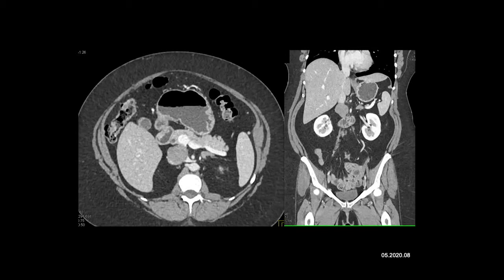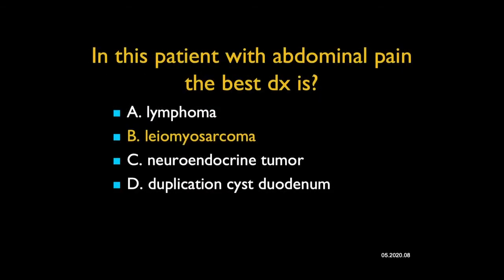This was a leiomyosarcoma. Then you would wonder, could this be a primary leiomyosarcoma, which arises from the IVC? But at surgery, the IVC margins were intact, and this was simply read as a retroperitoneal leiomyosarcoma. Just a very atypical case.